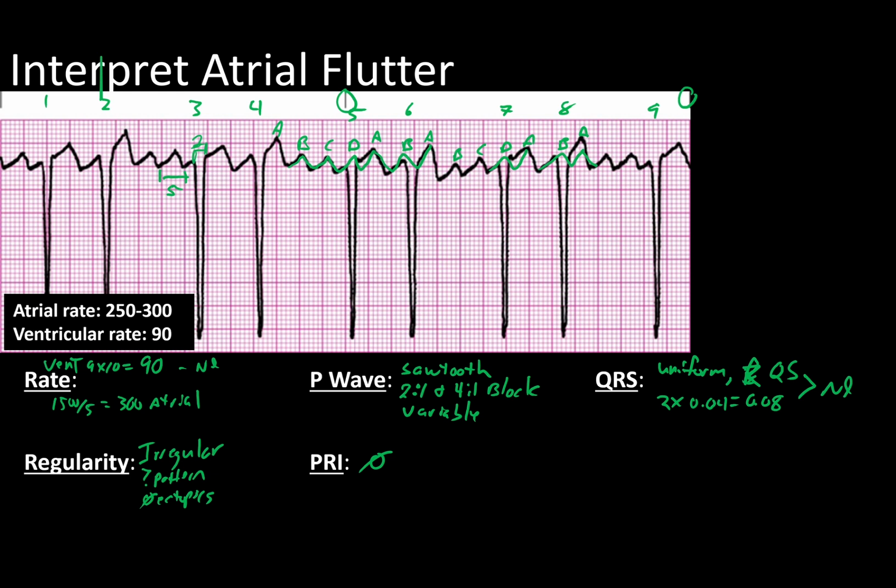Actually, I want to do a little bit better job marking these. So the QRS starts at this sharp point here, and it ends basically right here. So it'll be 1, 2, 3. Actually, I take that back. Which again, it's still normal.